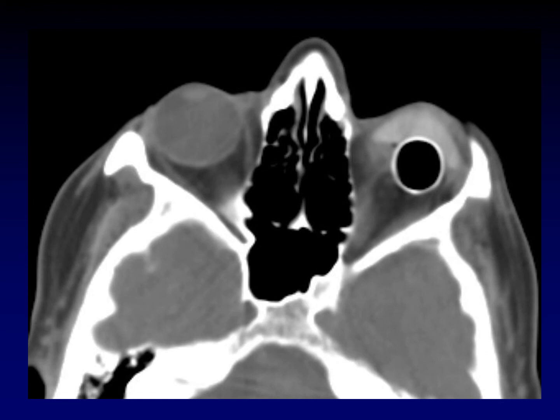This is an example of an ocular implant. Modern ocular implants, unlike glass eyes, have a complex structure with both posterior and anterior components. The posterior component is a sphere, smaller than the globe, but spherical in shape, to which you can attach the extraocular muscles. The anterior component is a facade that looks like an eye.